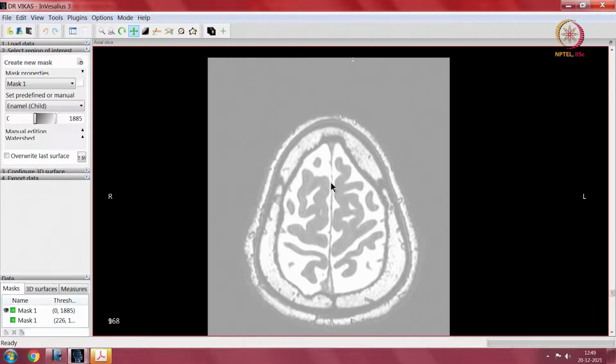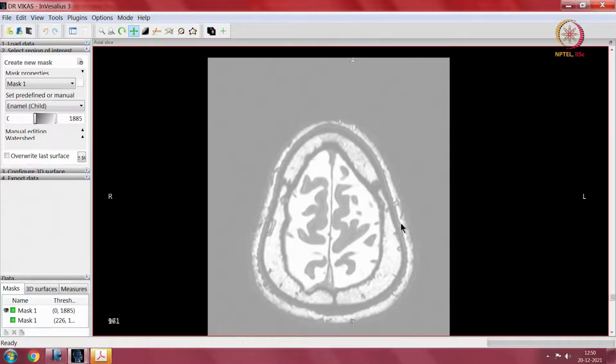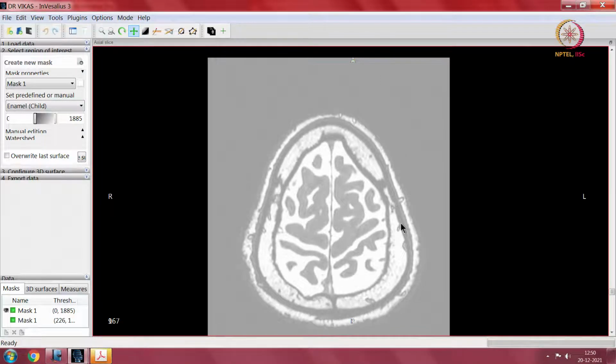The midline has all this swelling. So, gyri one, then there is a sulcus here, and then suddenly we dip into here and find that this sulcus is going all the way through up to the lateral part. That is a key differentiating discovery, and it is important because by that we have identified the central sulcus.